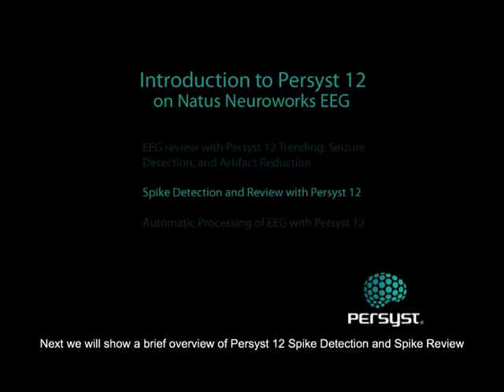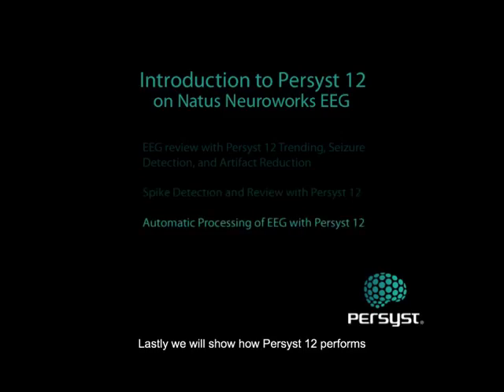Next, we will show a brief overview of Persyst 12 spike detection and spike review. Lastly, we will show how Persyst 12 performs analysis automatically during acquisition with no user intervention required.